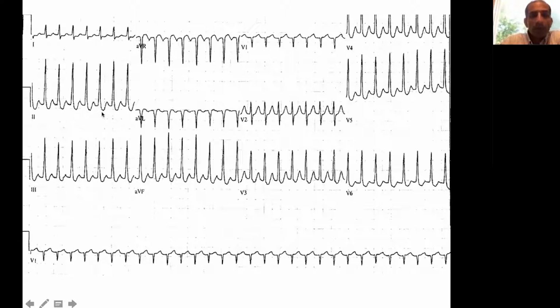However, in these patients, instead of having a pseudo S wave or a pseudo R wave, they have more of what we call short RP tachycardia, where the P waves are a little bit away from the QRS complex. It usually manifests as if they are having ST depression during tachycardia. You can see that this is the baseline, so the ST segment has gone down. Whenever you see that, you should think of a tachycardia involving a WPW pathway.